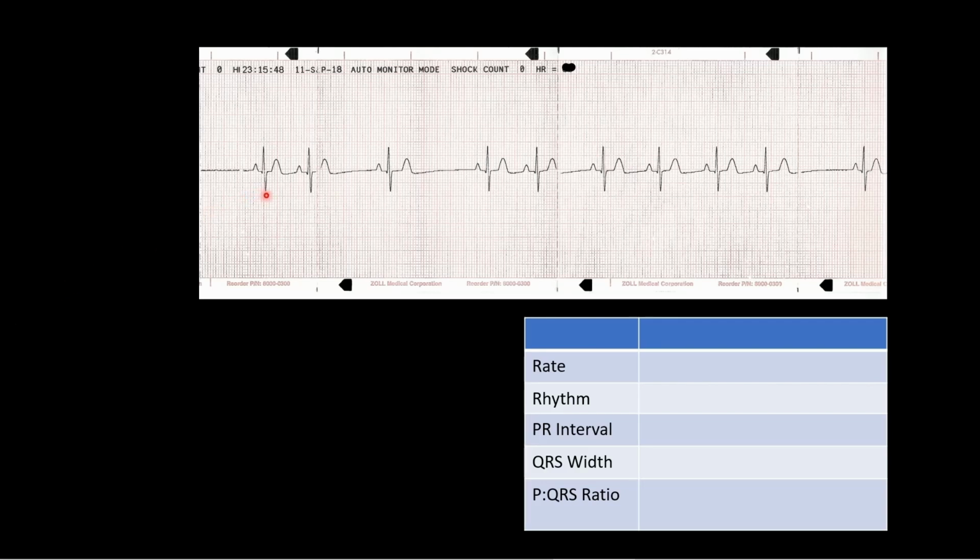If we start with the first one, we're going to say, starting from this marker here, we'll count out 6 seconds. 1, 2, 3, 4, 5, 6. We count back and we say, okay, we have 1, 2, 3, 4, 5, 6. All right, about 60. We'll make between 60 and 70 beats a minute, I'd say. And we keep going through.